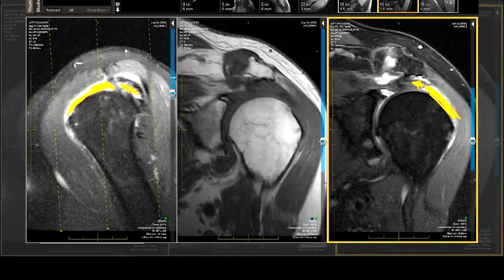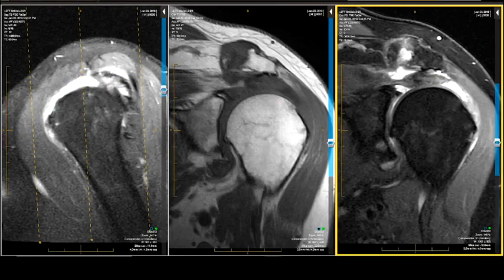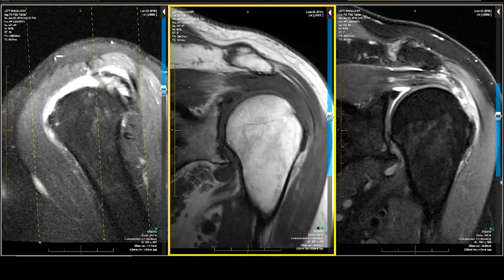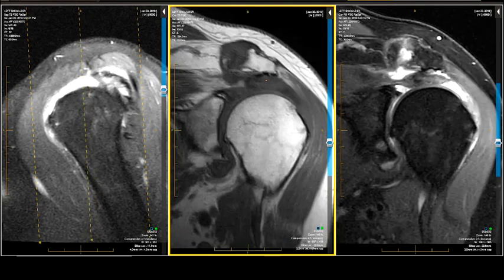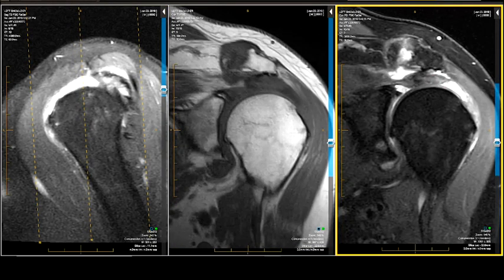How do you get that tissue back all the way over there when it's so sick? You may not have enough of it. You also have fatty infiltration of the myotendinous junction. You've got muscular volume loss, and you've got really nasty impingement. It looks like the keel of a boat or the end of a telephone receiver, a keel-like acromion producing outlet-related impingement. So she's got anatomic subacromial impingement, a large full-thickness, complete supraspinatus tear, 4 centimeters AP by 4.5 centimeters retracted with severe tendinopathy or tendinosis of the retracted tendon ends, period.